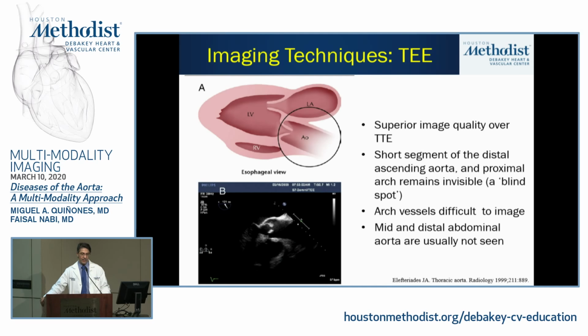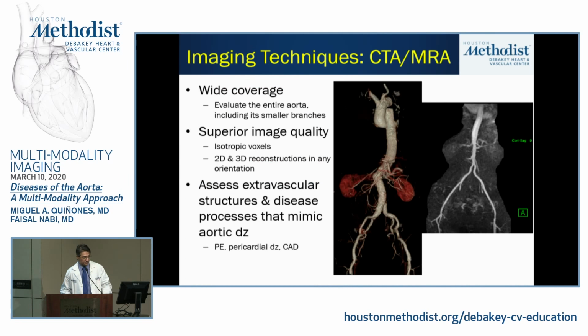Transesophageal echocardiography is very superior for looking at the aortic root and the very proximal segment of the ascending aorta. However, unfortunately, because the left bronchus comes between the esophagus and the ascending aorta, you are blinded to a very good portion of the aorta, from the ascending aorta to the arch. And then, of course, as you know, you can see the descending thoracic aorta well with TEE.